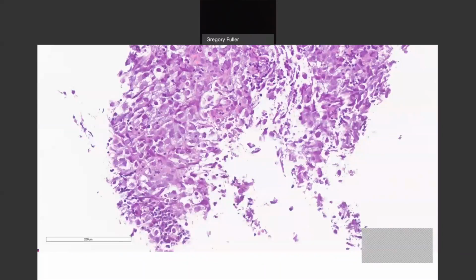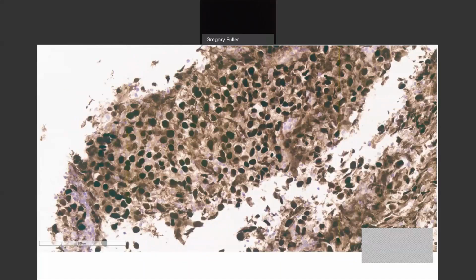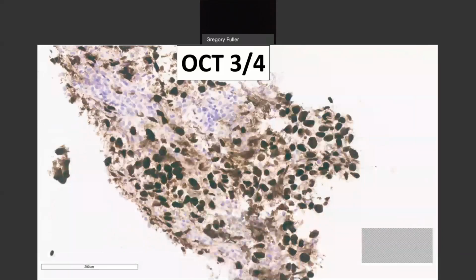I do. All right, and here's the immunostain. Any takers for the immunostain? I know that Dr. Gilbert and Dr. Harb and Dr. Alphatal all know it. Yes, Dr. Gilbert, that is correct. All right, yes, very good. Here we go, OCT4. OCT4 is the definitive, the signature immunostain of germinoma. It also could have been c-Kit. c-Kit's very sensitive, but it's not specific. OCT4 is specific. You like it? See the lymphocytes that are only hematoxylin? All right, here we go.